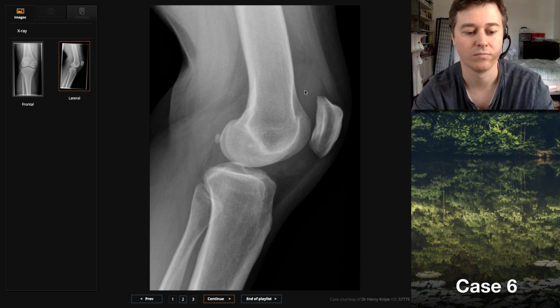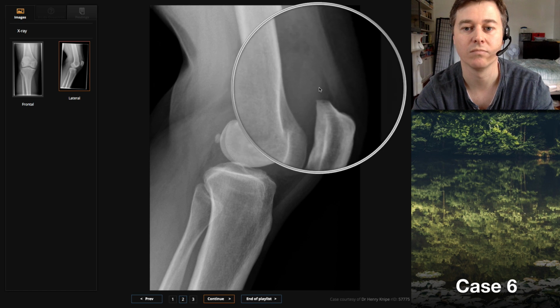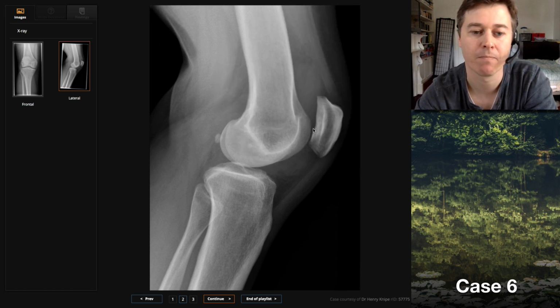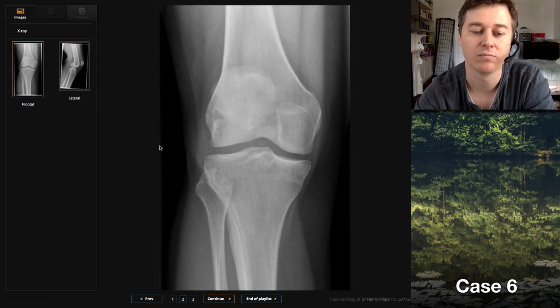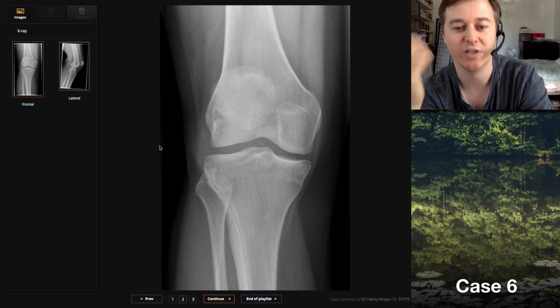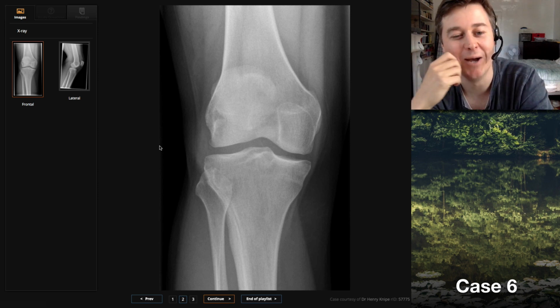The lateral images confirm the presence of a joint effusion, but no acute traumatic osseous injury, and I'd routinely further characterise with probably an MRI in a young patient. Particularly when you're in an MRI tutorial.